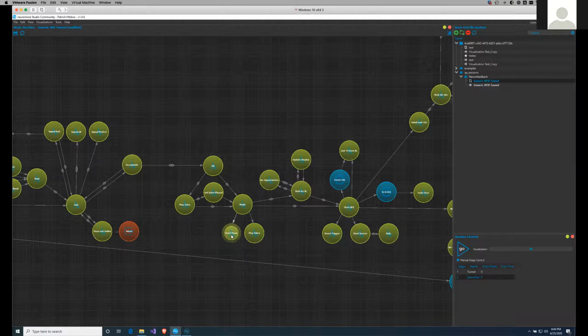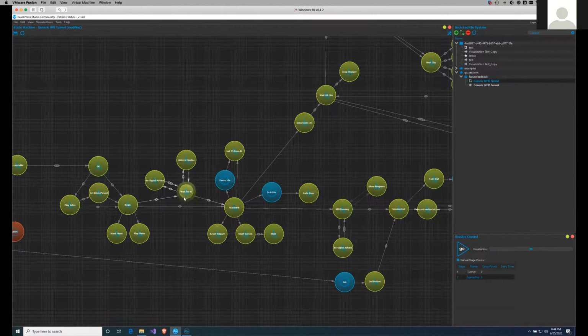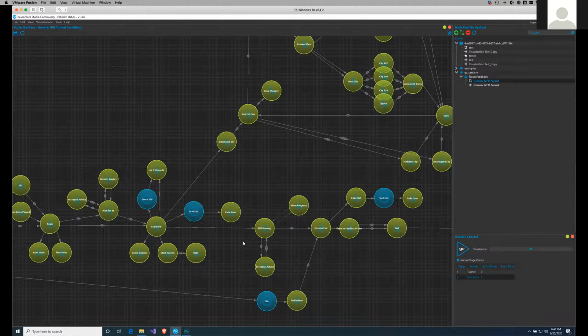Then we begin. We play a little background music, and we play a little background video within the studio. And no worries, we will look at all that in action. I just want to walk you through how everything works that we're about to look at. Then the baseline is being captured. If the signal drops during baseline capturing, we give some advice, we show the progress of the baseline, and then the neurofeedback session begins. That's where the training begins. While the training is running, the classifier is fully active, so the visualization gives feedback, in that particular case, through the speed in the tunnel and through the volume of the background music.